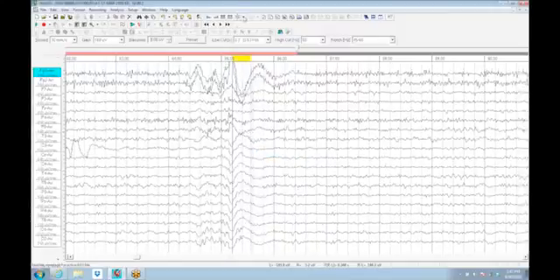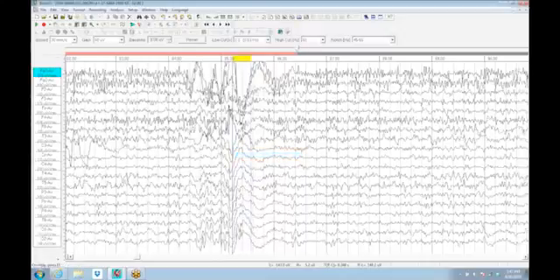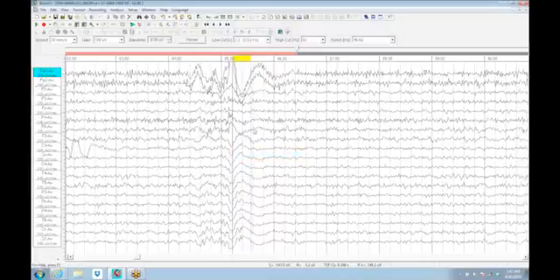montage to an average reference, and this is the montage selector, the drop down. I went to an average database version 2 AV. This is the global average. I turned down the sensitivity a touch. Now you can see in the front it's going down, in the back it's going up. It identifies that the location of the dipole is actually in the front of the head, but it's not in the front. It's behind the front and in front of the back.